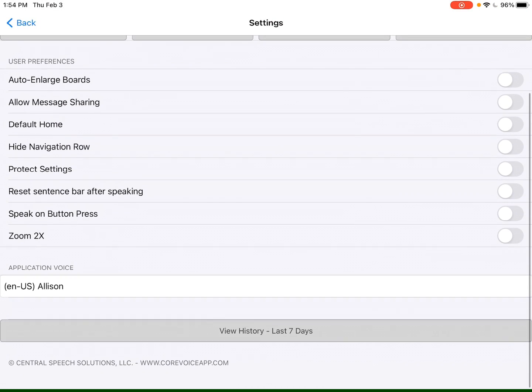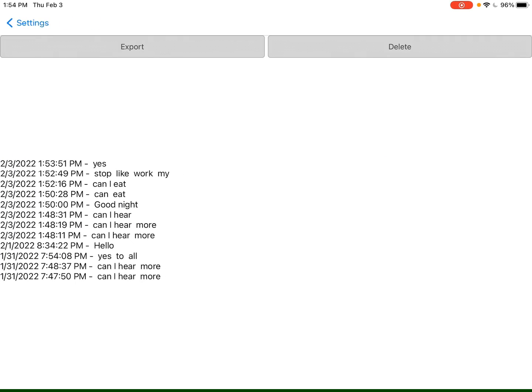I'm going to show you also, this is amazing for therapy sessions. We have added viewing history, and it's the last 7 days. So it puts a date stamp and a time stamp. You can export this, which is phenomenal.